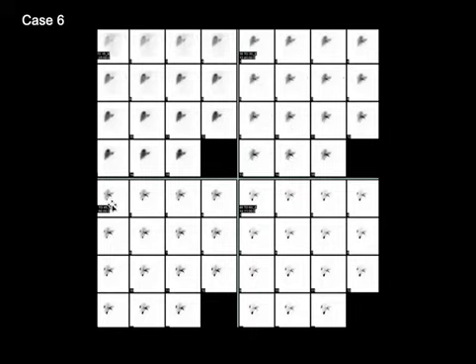And as we follow that focus on the surface of the liver, we find that that focus increases in intensity. And on the last image, that focus is seen here. It's outside the liver, and this finding is consistent with a small bile leak which happened after a liver biopsy procedure. Small bile leaks like this can be treated conservatively, and there is no need for any intervention. So here's an example of a small bile leak post liver biopsy.